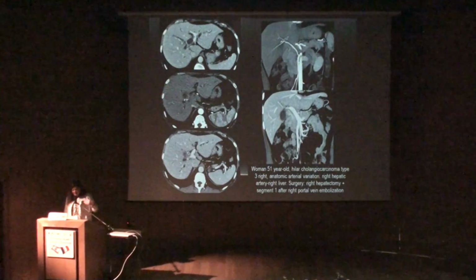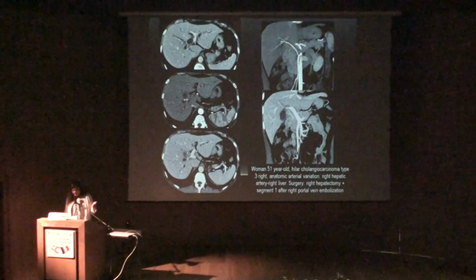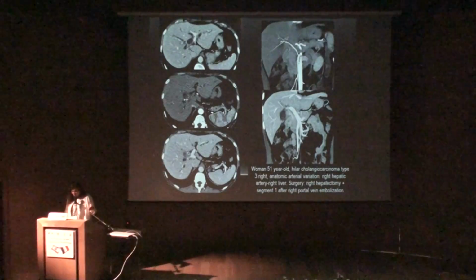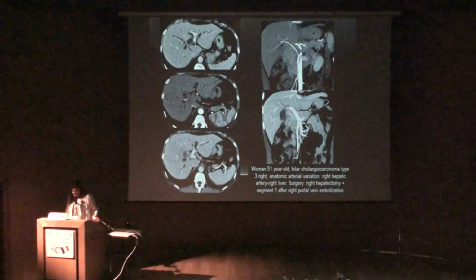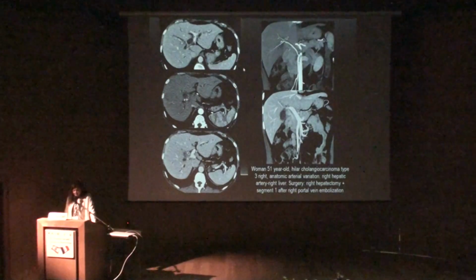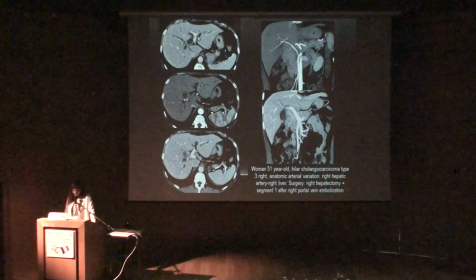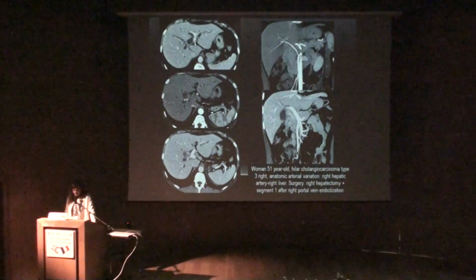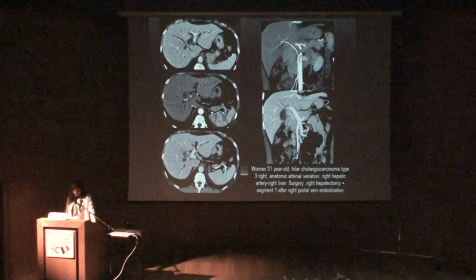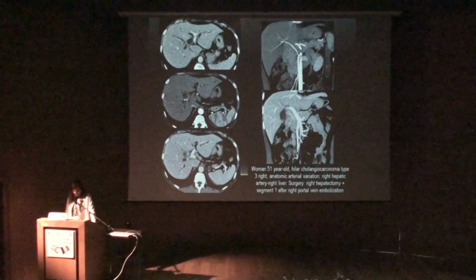And exactly like for the bile duct anatomic variation, MDCT is very nice to show you hepatic arterial anatomic variation. Here, for example, in this patient, you see this bile duct dilatation in the left liver and right liver. You see very nicely this lesion here on arterial phase and here on portal phase.